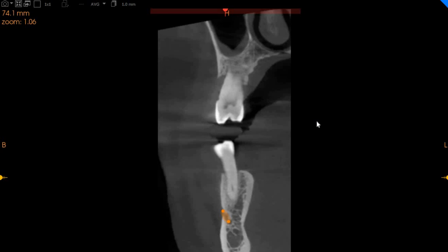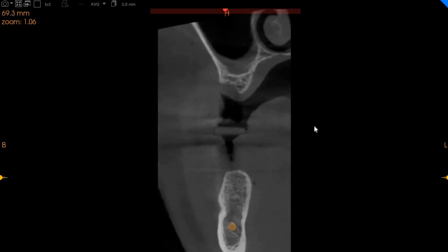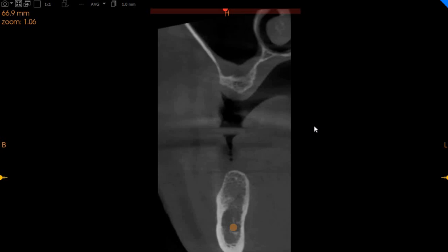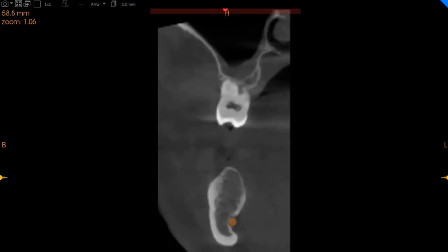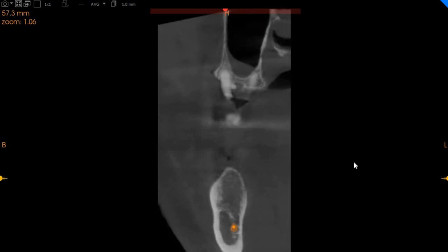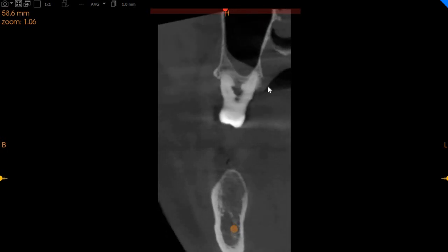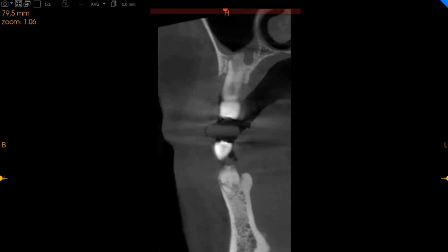We'll take you through each tooth quickly. So this is the second premolar. We've got bone only on the apical 1/3. The region of the sixth, again, very little bone, no bone for implant placement. And then we move on to the seventh. Again, very little bone present, as you can see, bone loss, even including the furcation area. And so hence the upper right quadrant is not doing very well in terms of periodontal health.